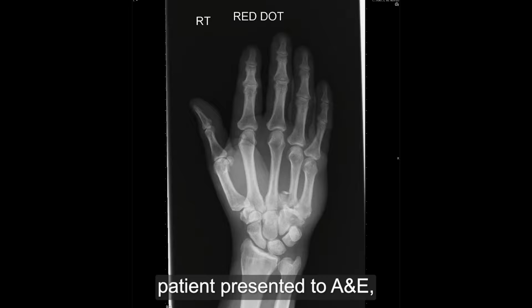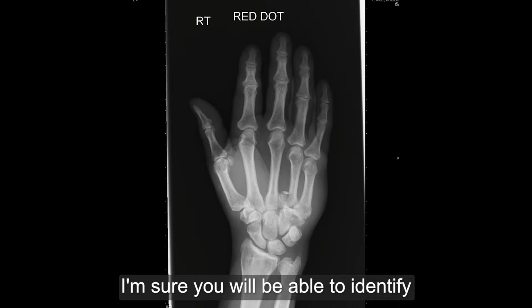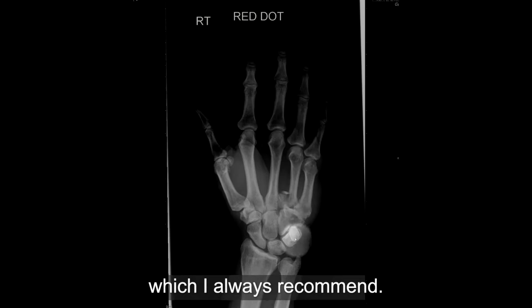This is a patient presented to A&E. Patient is 64 years old, male, with a fall and suspected fracture. The moment you look at this radiograph, I'm sure you will be able to identify there's something wrong at this side. It depends on your level of experience. You may spot this on the first look, or it may take you some time by following the bony cortex, which I always recommend.